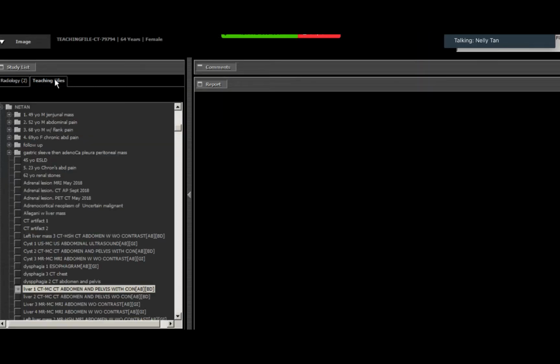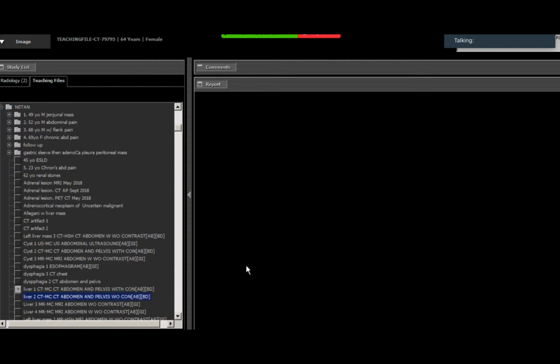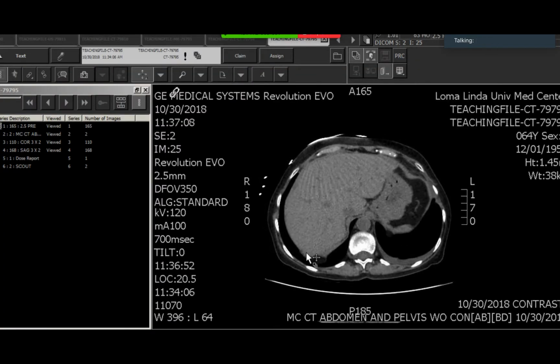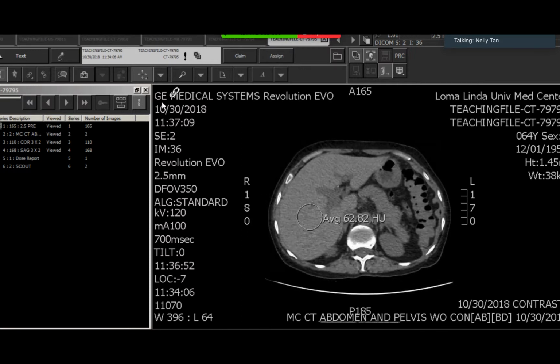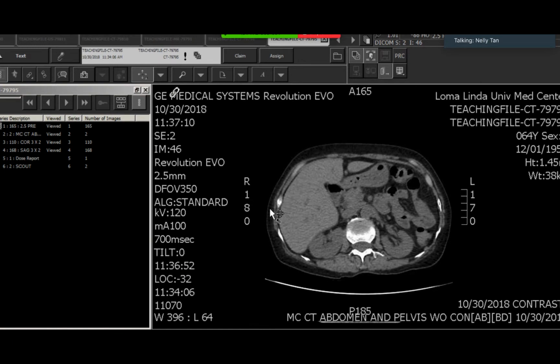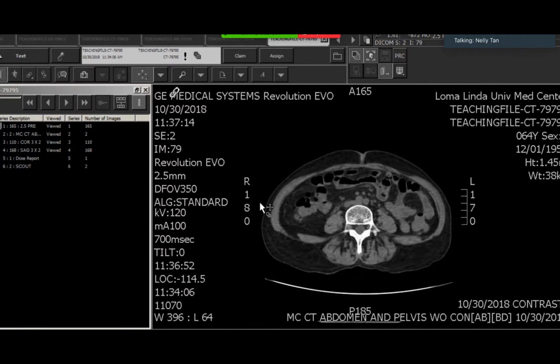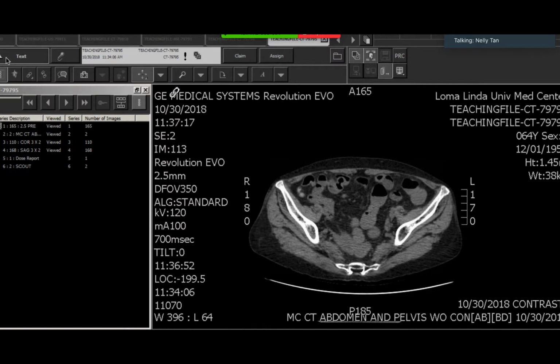And then the patient got this follow-up non-con CT. And the time interval was within a month. So this was 10:30, and the one before that was, oh God, I don't know what it was, but it wasn't that large of a time interval. But so there's nothing in the liver. Let me see, what else? I don't think we saw anything else significant. It was non-con, so it was hard to appreciate the bowel abnormalities that we saw in the initial scan.